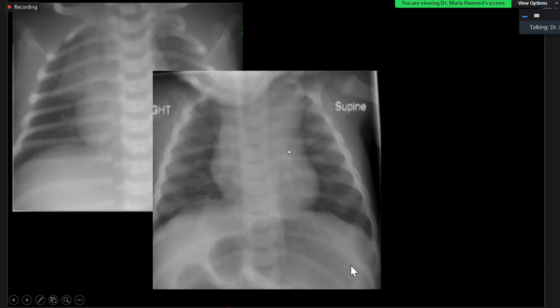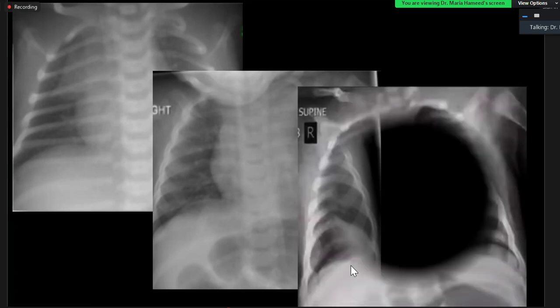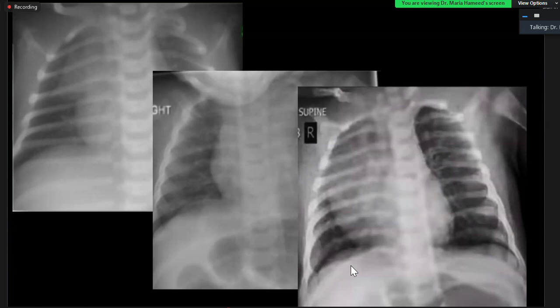Because of the normal anatomic configuration of the aortic arch, most of the time you're getting this thymic tissue on the right, but sometimes on the left. So beware of that. And here is another X-ray in which the thymus is extending from above downward up to the right paraphrenic region, up to the diaphragm and the right pericardial margin. So basically, it can have many phases.